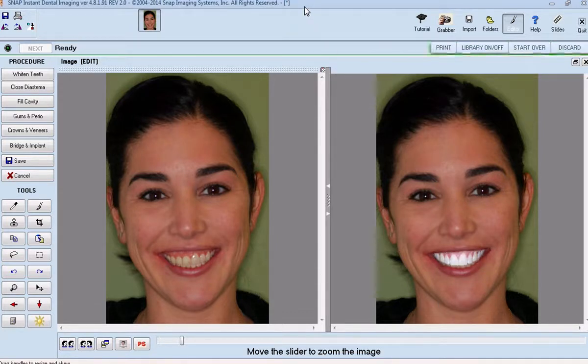But always make sure you let the patient at least take a picture of this with their cell phone. You can also email it to them if you were to pull the folder up, but I find it easiest just to print them a copy and let them take a cell phone picture. Your hygienists, your assistants, my 3.5-year-old daughter can all do this smile design in less than 5 minutes. Totally worth it. Patients will love the results and you'll change a lot more lives and smiles with it.